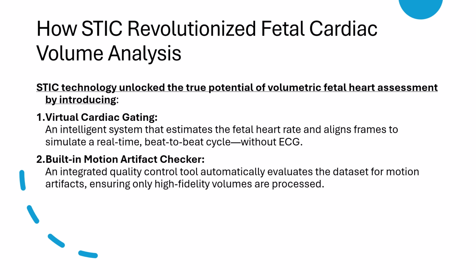Next, there is the built-in motion artifact checker. One of the biggest hurdles in volumetric imaging is ensuring that the captured data is free of motion artifacts, especially with a moving target like the fetal heart. STIC technology comes equipped with an integrated quality control tool that automatically checks the dataset for any motion inconsistencies, ensuring that only the highest quality volumes are processed.